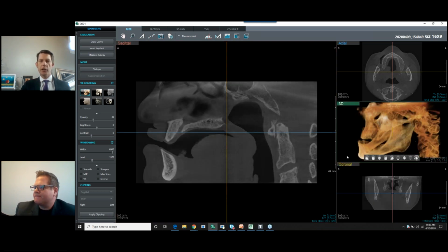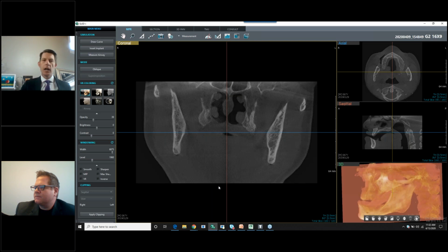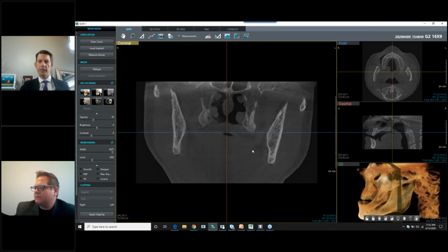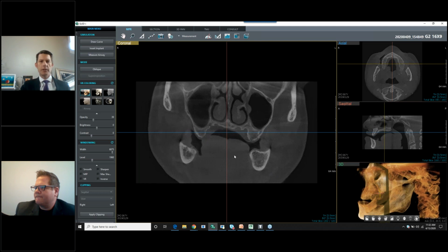So these two things could cause some issues with positioning, and really we're going to have to make some extra efforts to move this around to get an accurate image here, or an accurate orientation, I should say. So I'm going to move this forward, and let's scroll here. And what I'm going to do is grab my axial slice, so we're going to bring this down, and I'm going to go ahead and get this lined up and rotate.